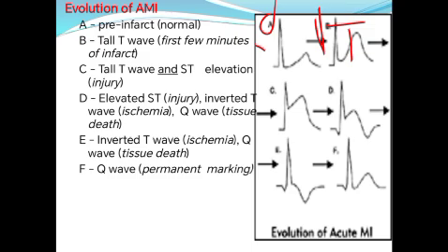This is after 1 hour, and then we have an elevated ST segment, and then we will have an inverted T wave. ST elevation, then T wave inversion.